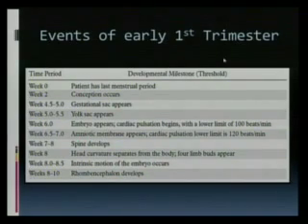7 to 8 weeks, the fetal spine develops. By 8 weeks, you will have a head curvature that separates itself from the body. So you will have a segmentation of the embryo. You will see a head that looks a little different. There will be some neck segmentation, a little constriction. So like a head and then a body. By 8 weeks, you should be able to identify all 4 limb buds. Usually the pregnancies that we see are within 8 weeks. We seldom see any pregnancies that come through the emergency room after 8 weeks. But that's okay. You should be able to see the limb buds.